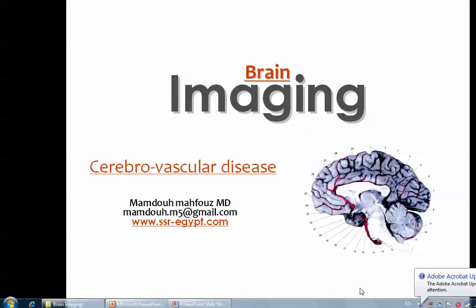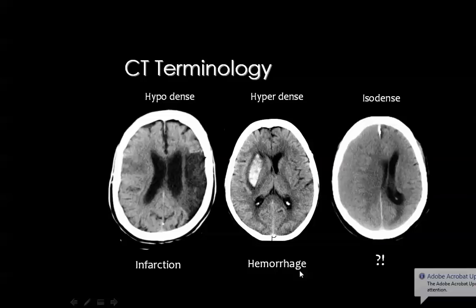Dear colleagues, this is the second talk in the series of diagnostic radiology in English, which are referred to by the abbreviations DRE. And now we'll start the discussion of the cerebrovascular diseases. The first talk discussed the normal anatomy of the brain, including the venous and arterial anatomy. Then we'll proceed now to the evaluation of the cerebrovascular diseases.